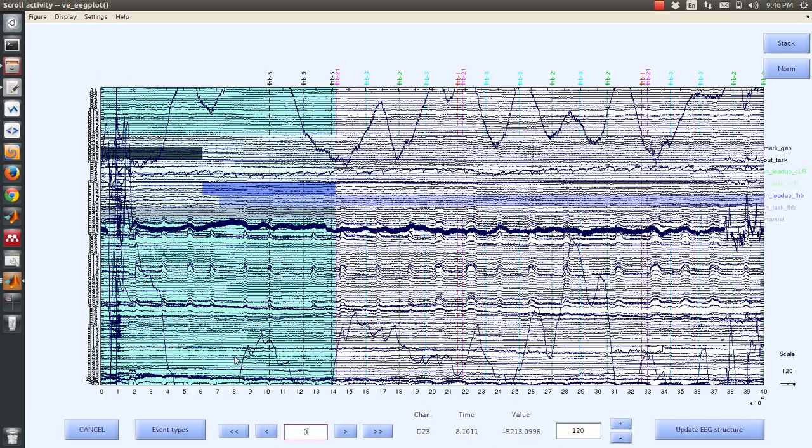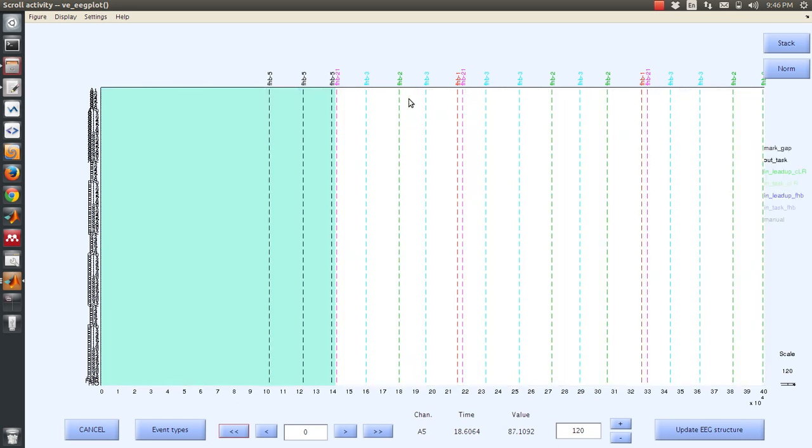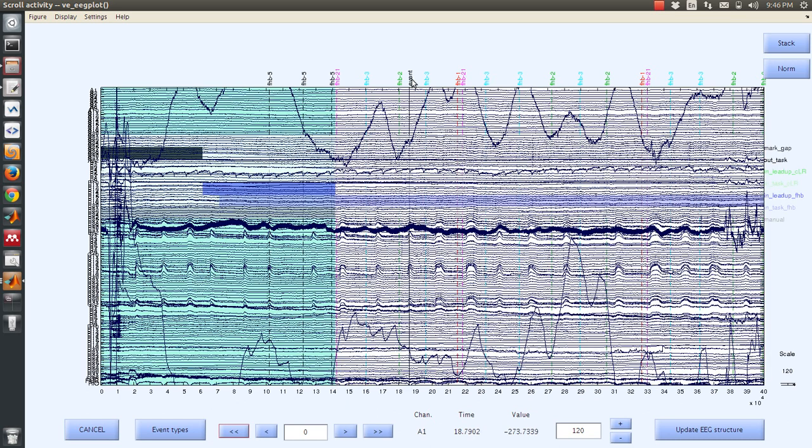Now, with the key commands that I specified, what we can do now is if I go over the axis window and I press the key E, this will add an event with the lowercase e. But if I move over and I press capital E, then it will add event with capital E. So this is just a demonstration that we can now have a library of events that we can just add by clicking a key on the keyboard.